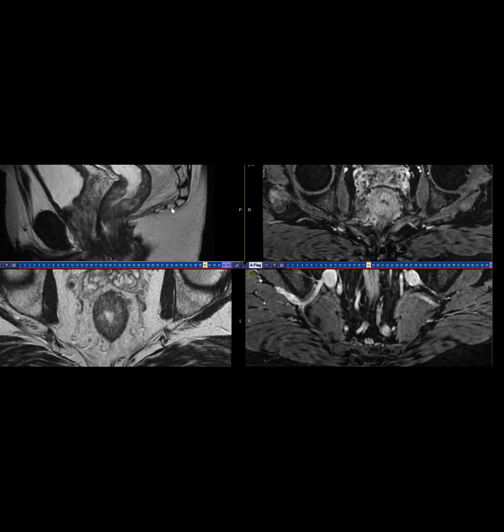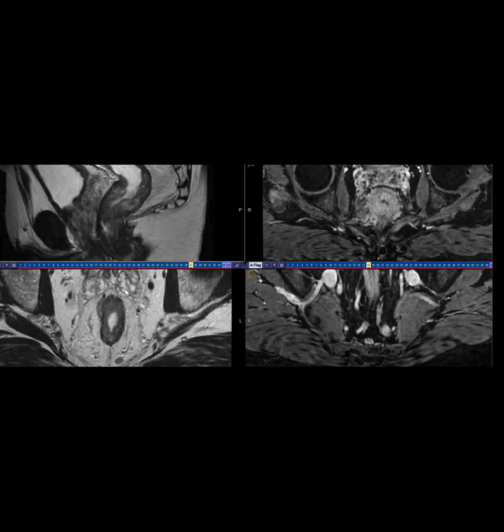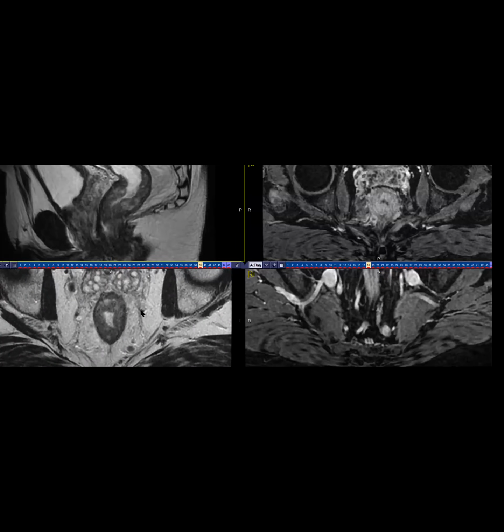And from the literature, we don't have a large number of cases, but they say in these cases you will see more submucosal edema than you would see with cancer, and you might see engorgement or enlargement of the seminal vesicles, which maybe you can say here, but it's not really specific. So we actually called it a tumor, and we staged it based on the primary suspicion. However, given the final findings, we thought that this warrants at least some follow-up.